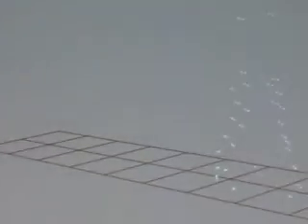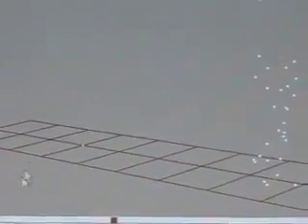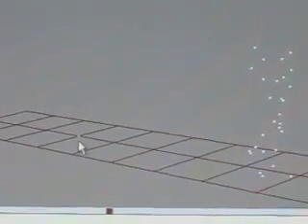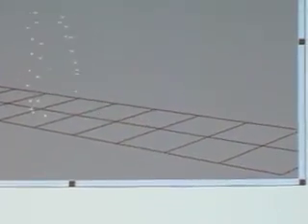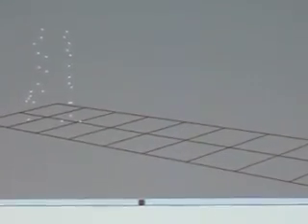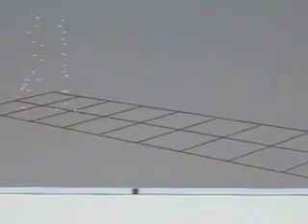You see all the markers reported. But this one here, I think, is the missing coordinate 0, 0, 0, and we did not remove it, so we have a missing coordinate. It looks like it fell off the heel. That's what it was marking. There was a problem with the heel marker tracking, and I think that it was trying to add that right there. It's not fell off. Oh, okay.